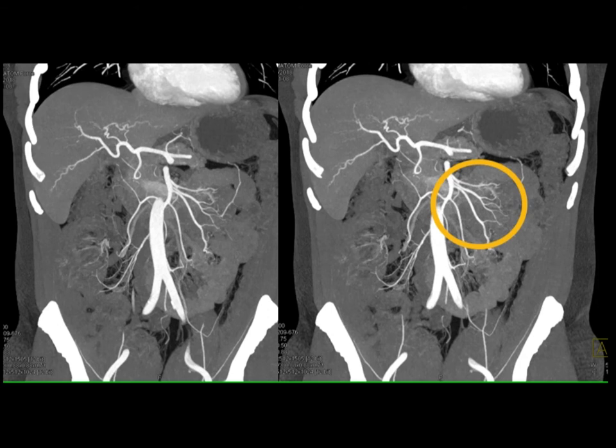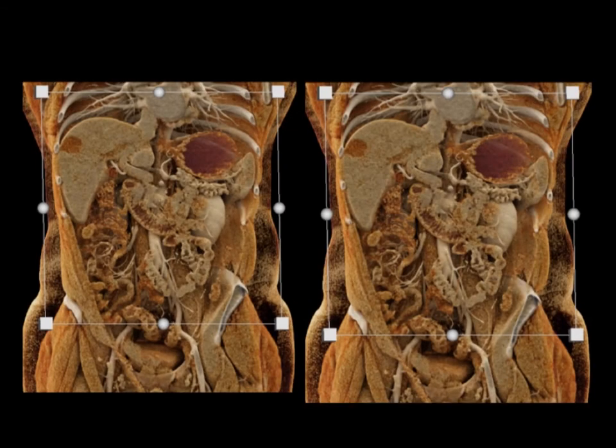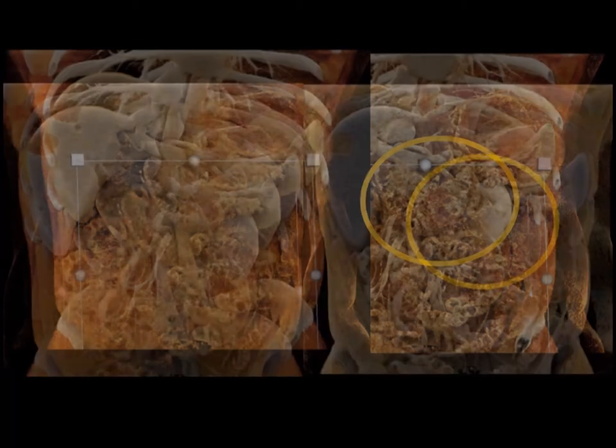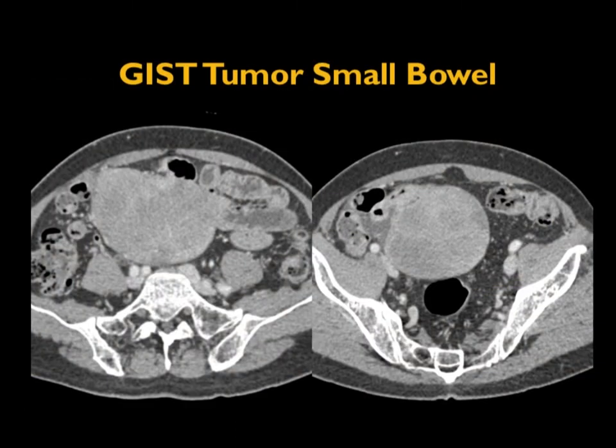So you can see this patient tumor, a lot of involvement, but again, showing you the entire process from the arterial side to the venous side to the cinematic rendering, where you see very nicely the tumor, you see the patient's vasculature, you see the liver cyst, you see the tumor infiltration, you see where the transition is, you see what needs to be done specifically in terms of that tumor from multiple projections. Very nice study. Another example, a large GIST tumor, right lower quadrant.